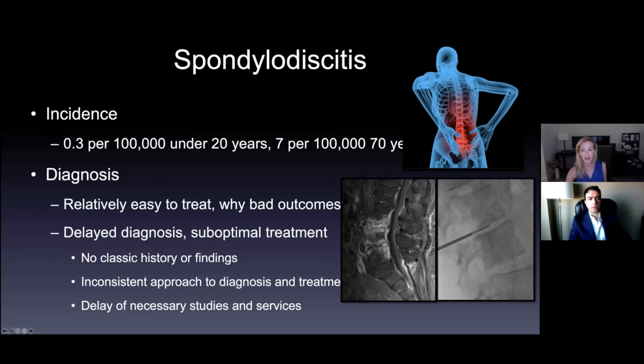But Wendy, could you? I'm sorry to interrupt you. Can you tell us what that left MRI image is? Peter was asking what the bug was? Can you describe that MRI image, that sequence?